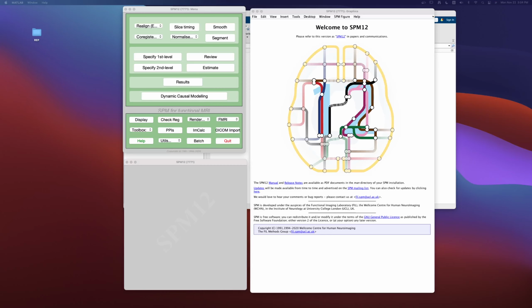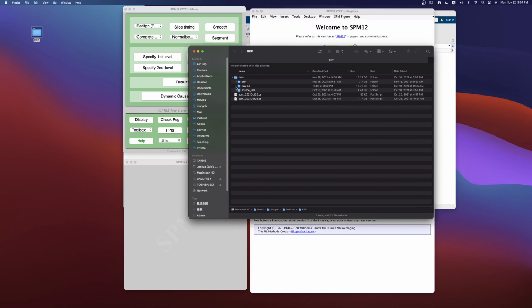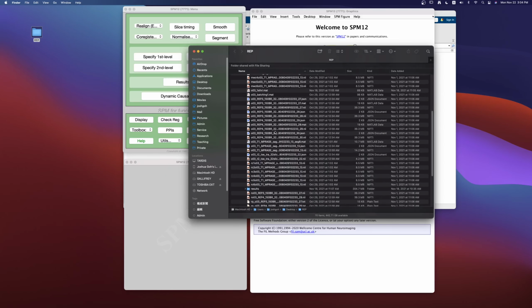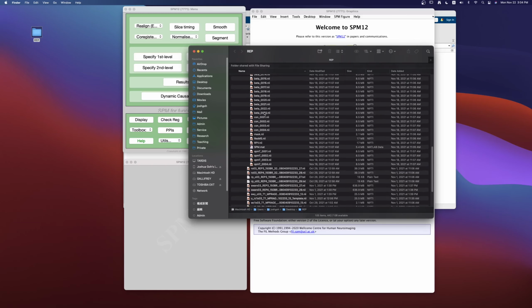Okay, once we're done with all the first level or subject level processing, and we have for every subject the necessary contrast files, just to review, we must make sure that the data files in all subject directories have in their results folder the necessary contrast files for con 1, 2, 3, 4 for the P11, P31, P32, and P33 responses averaged across run 1 and run 2.